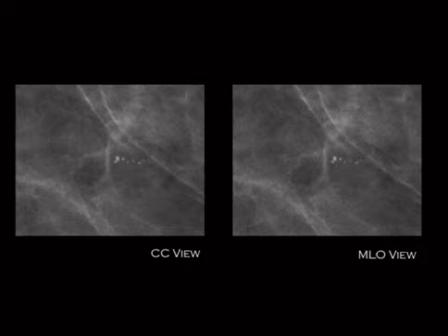You can't accurately describe them off of the baseline screener, and you don't want to use your digital zoom. You want to actually bring them in and have real mag views done. So what we're seeing here is some round calcifications that are clustered and have the exact same morphology on both the CC and the MLO view. In other words, they look exactly the same. It's almost as if I copied and pasted the exact same picture and then just changed CC view and MLO view at the bottom. They really look that similar.